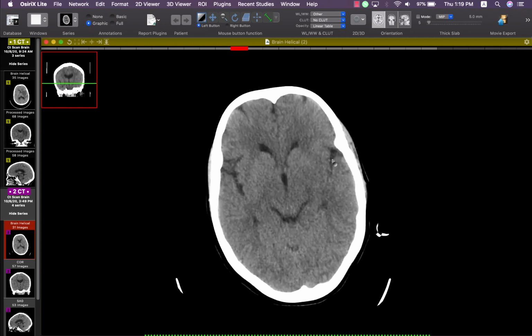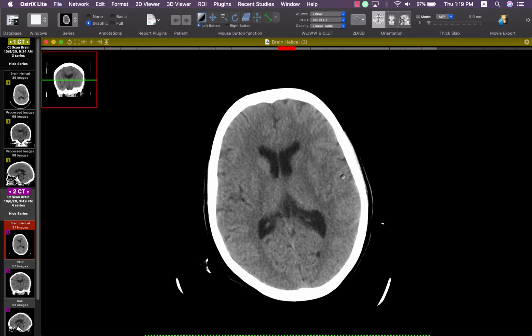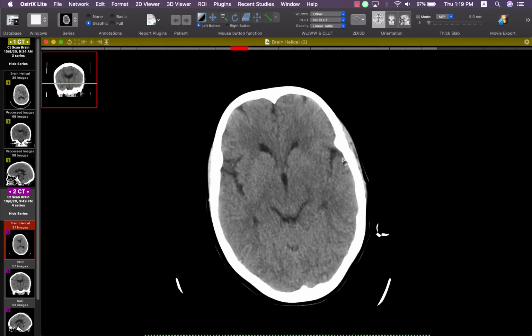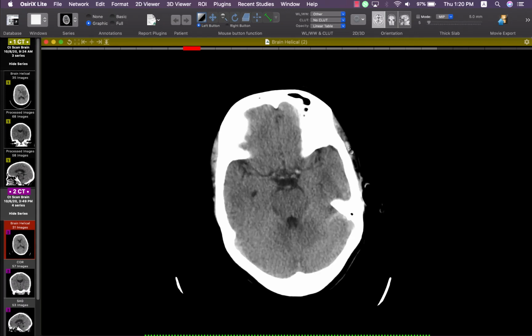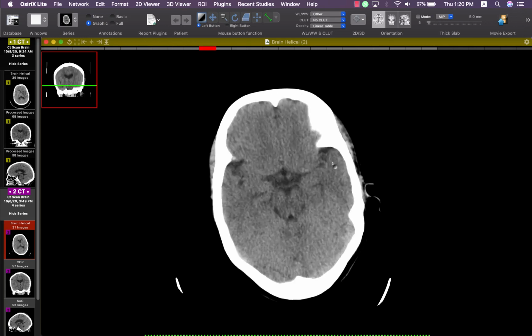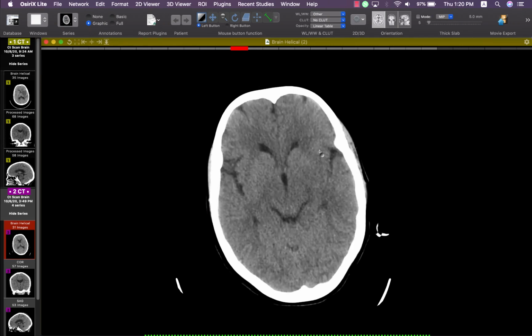These signs are usually non-specific or non-sensitive actually, but we should look for them if the only available modality is CT and in clinical practice there are signs and symptoms of acute ischemia. We should look for the hyperdense vessel sign and the disappearance of the basal ganglia sign, which are the earliest signs of acute ischemia in the CT brain.